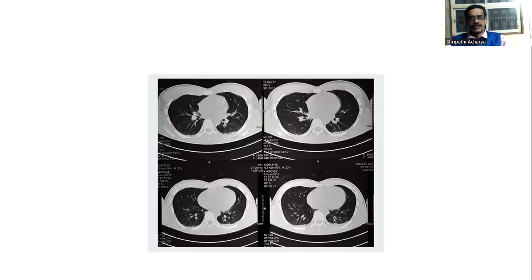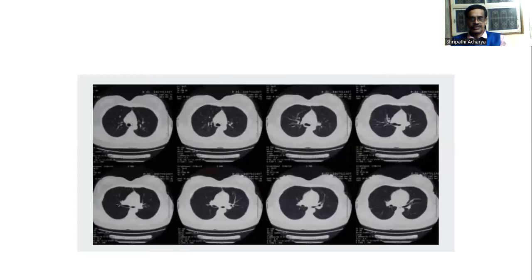This is a film containing the CT scan pictures of the chest, you can see lungs, heart, and thoracic cage. You can visualize bronchioles. Another film where you can see the tomographic structures of the chest. You can see the lungs, heart, the thoracic wall.